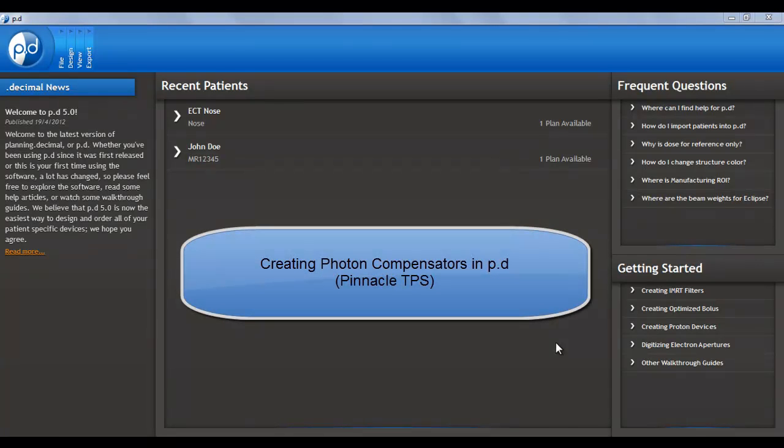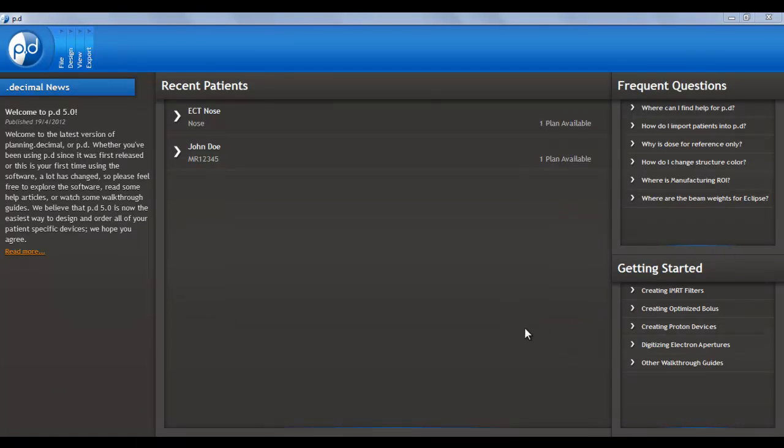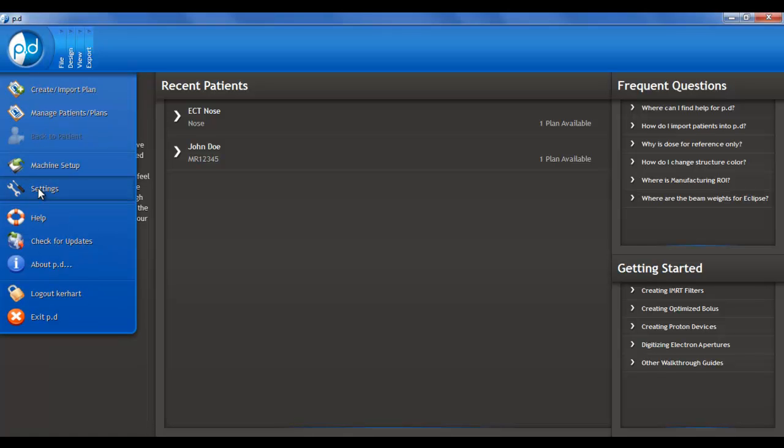Welcome to our P.D training video for Photon compensator part creation using the Pinnacle treatment planning system. So the first step when we have P.D open and logged in is to go ahead to our P.D planning menu and choose the settings.